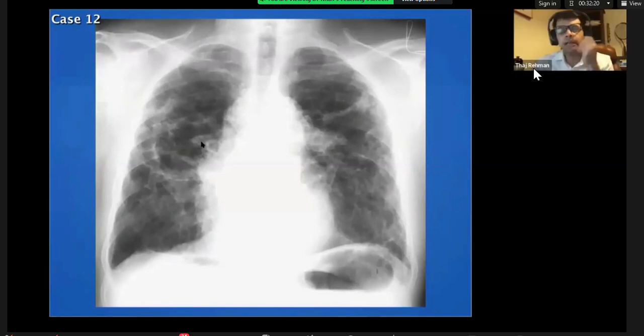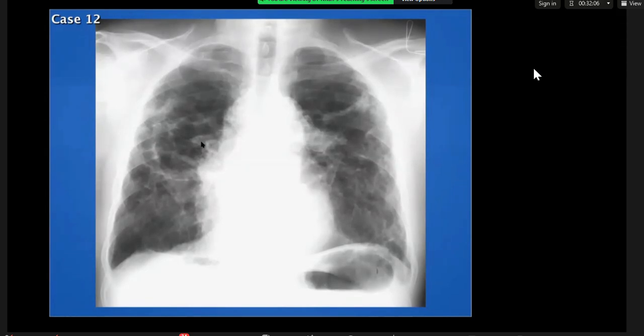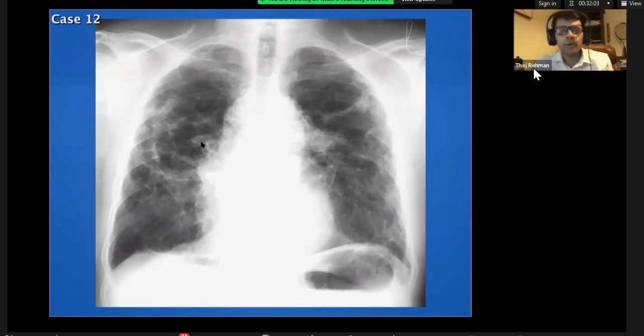Yeah, good. You correctly identified the parenchymal destruction of a chronic lung disease that affects parenchyma. This is distinct from the interstitial fibrosis, the chronic UIP pattern, isn't it? Yeah. Here there is parenchymal destruction and a lot of big fibrotic strands altering the overall lung architecture. Unlike interstitial fibrosis, which is more of a uniform reticular pattern with volume loss, this is non-uniform parenchymal destruction with no significant reticulation. This is sarcoid, and this appearance can occur in TB.